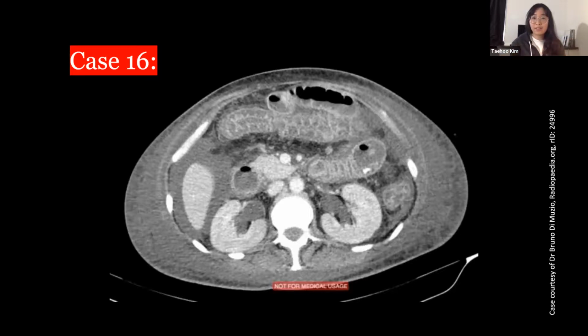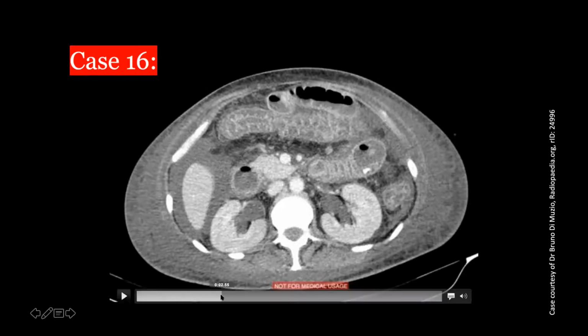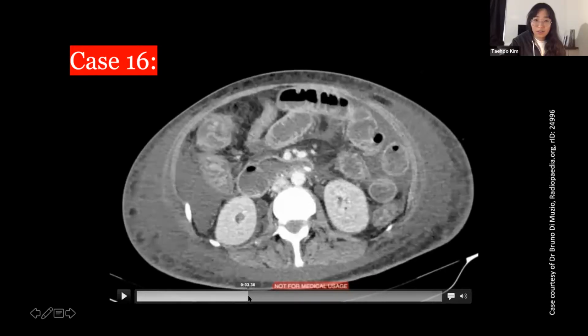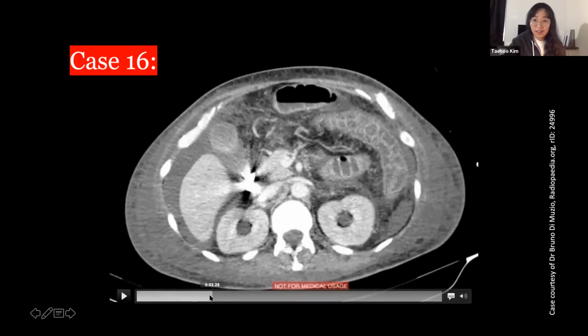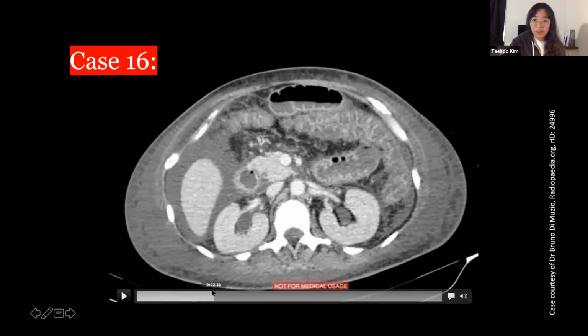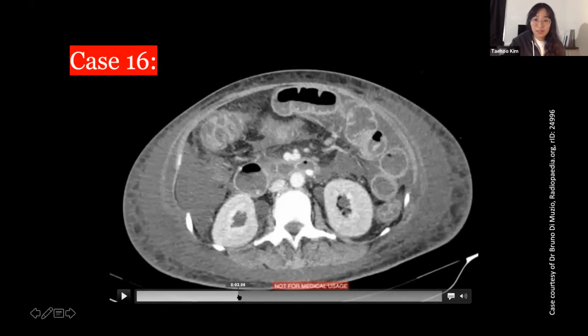Diarrhea, isolation. Yes, C. diff colitis. You got it. So this is the pseudomembranous colitis finding. It generally affects the entire colon. It's thickened. It's different than Crohn's disease, where it affects the terminal ileum mostly.